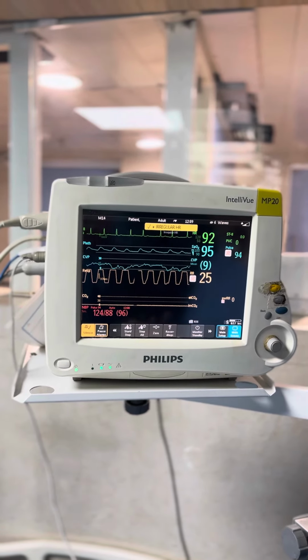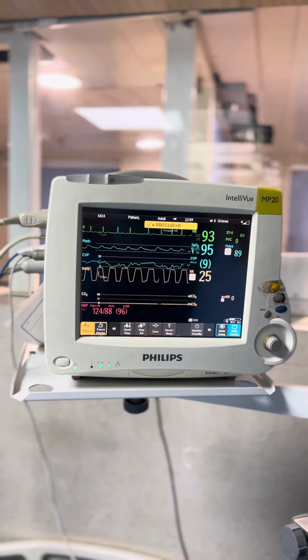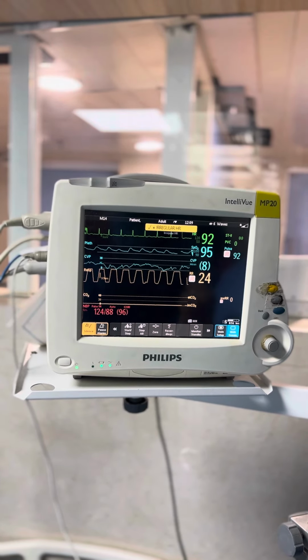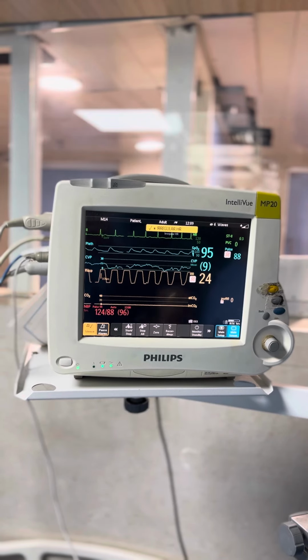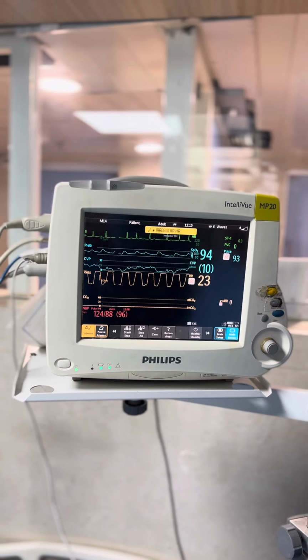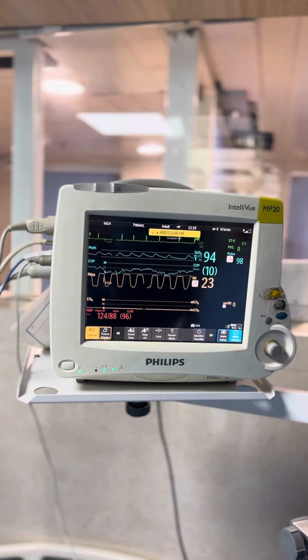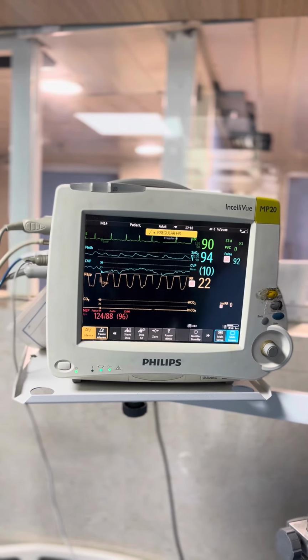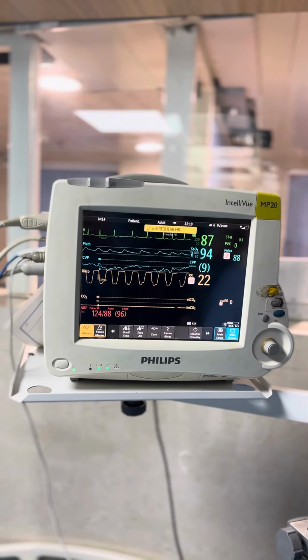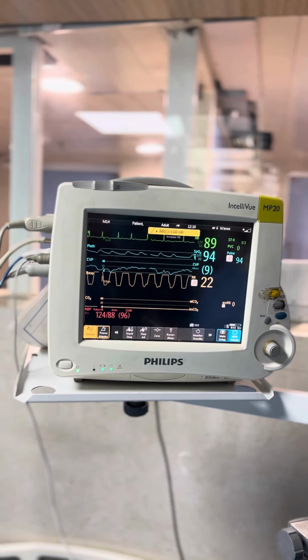This type of abnormal ECG is still not causing any hemodynamic disturbance for this patient. And this is the commonest rhythm disturbance we'll come across in valve patients. Mitral valve disease, either stenosis or regurgitation, this is the commonest rhythm we'll come across. And this is the rhythm which is seen in senile, old people, without any disease in the coronary arteries. What is that rhythm? That rhythm is called atrial fibrillation.